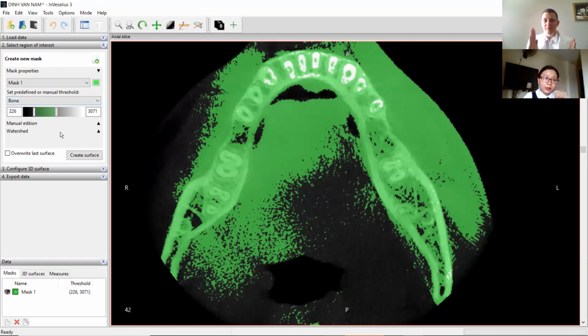So here you have the bar where you can select the density interval you want. You say maximum value this, minimum value this, and all the voxels that are in the middle will be selected. Thì ở cái phần thanh công cụ ở bên trái cái màn hình, có cái phần xanh xanh đấy là cái khoảng density mà mình cần chọn, tức là cái khoảng đậm độ mà mình cần chọn. Ở đây có cái phần lớn nhất và cái phần nhỏ nhất.